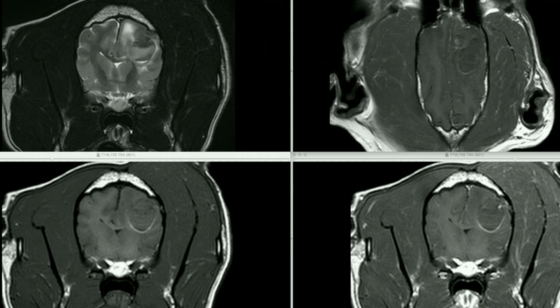In this case, the lesions appear very heterogeneous. We don't see a complete hypointense rim, which is often present with benign hemorrhages. If we look at the T1, the T1 hyperintense periphery, which is due to methemoglobin, is incomplete. And on the post-contrast images, we see there are areas of abnormal, slightly nodular, heterogeneous enhancement in the periphery of the lesions.